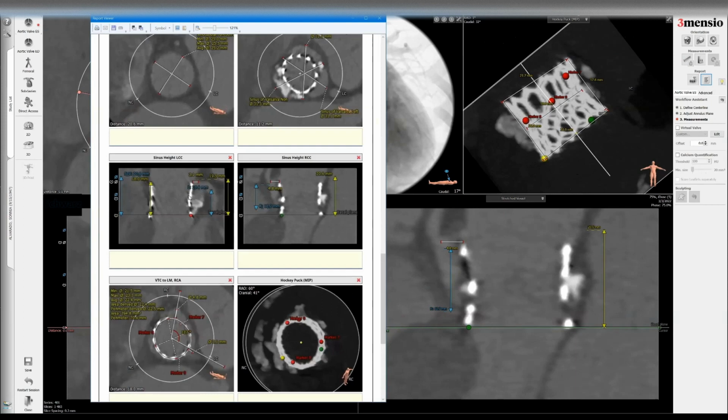Now, remember, you're going to put a second valve in there, a balloon expandable valve, and you want to expand this further because this is underexpanded. You might reduce this distance to the coronary, so you might actually risk coronary obstruction if you expand this further. Just keep that in mind. If you don't, the trade-off is that you might have an underexpanded second valve, leading to subsequent hemodynamic compromise and maybe even durability issues. So keep that in mind in pre-case planning: whether you want to expand this fully, which I would recommend first, so you can fit a better transcatheter valve and get better expansion of the second valve, because usually the second valve would be even more constrained.